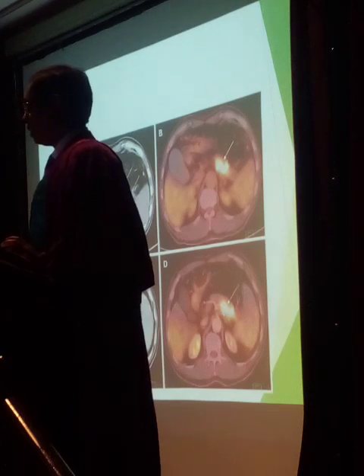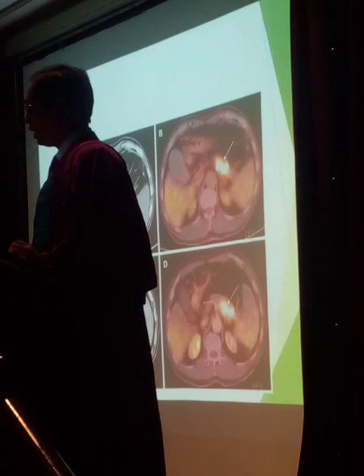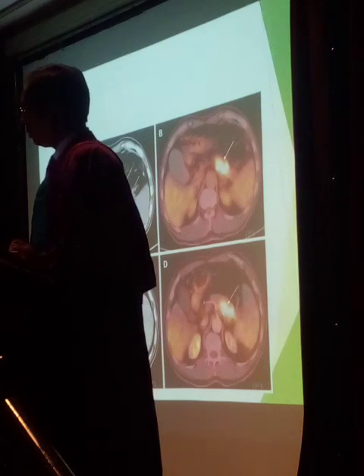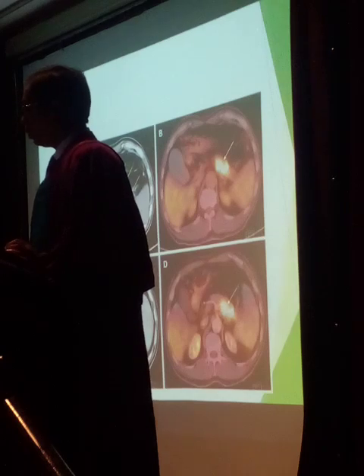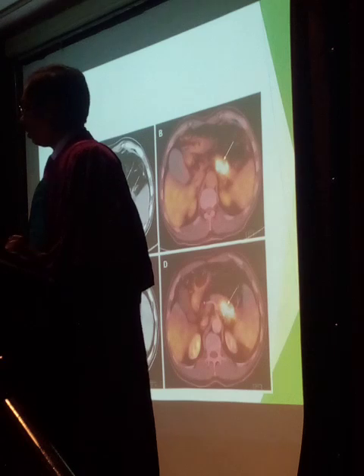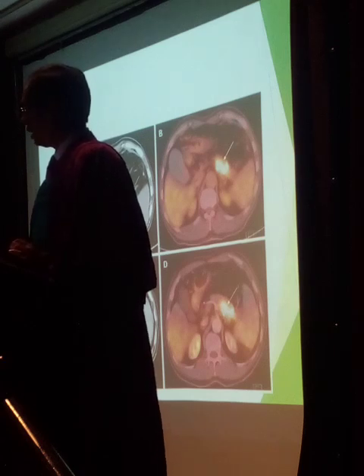But even a small 1 centimeter area, which may be post-surgical fibrosis in CT, or a very small, maybe reactive, lymph node in CT, can be differentiated by PET-CT, because pancreatic carcinoma is a very aggressive type of cancer, so we can get a very bright spot even if it is very small. So it's better to do follow-up or early recurrence assessment by PET-CT than the other three main tools.